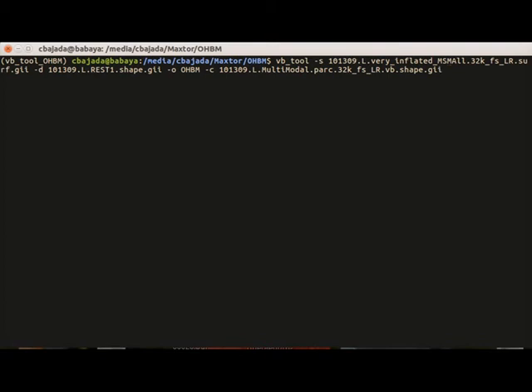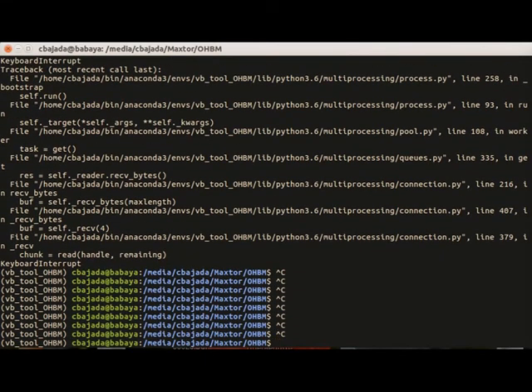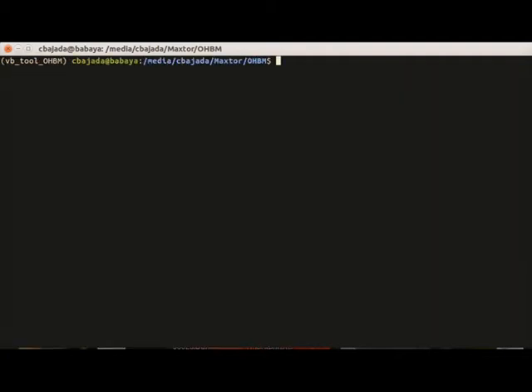the clustered. And if you want to run full brain, you go to the same thing as if you're running a searchlight, but this time you put in the FB flag, and that should now run your full brain analysis. We can wait. Running full brain, this is the gradient analysis. And again, if I let this run, it will take forever, and it's only taking forever because this particular laptop is somewhat slow. Okay, so that's all you need to do to run the 3 types of analysis.